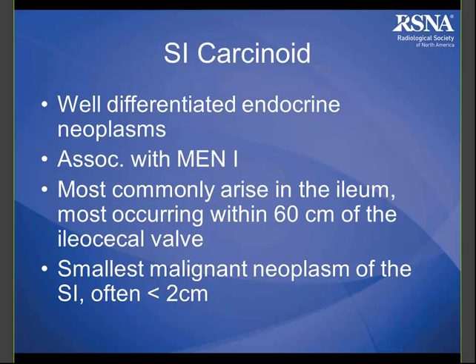That's why they can be really hard to see even with CT enterography. Sometimes we see some lesions there that are more mass-like. Other times we just might see some abnormal wall thickening in the distal ileum, maybe terminal ileum, that's hyperenhancing compared to the other adjacent bowel, but oftentimes we don't see the primary lesion.